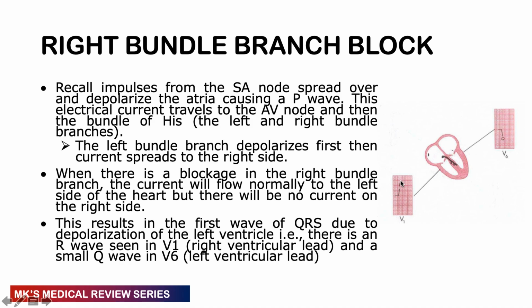This is the normal progression of the R wave. I'll talk about this when I look at the R wave on the last video of the QRS complex interpretation. When we look at the R wave progression, we shall see and explain this again, and we shall see that this is what is normally supposed to happen.